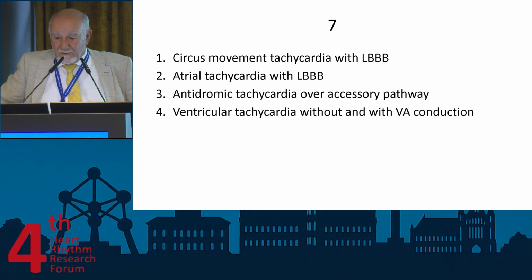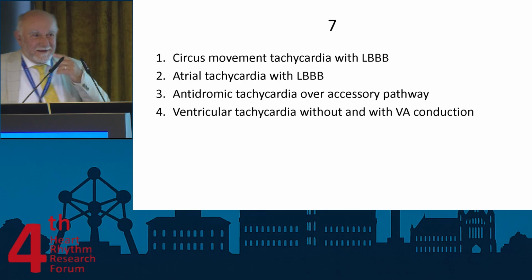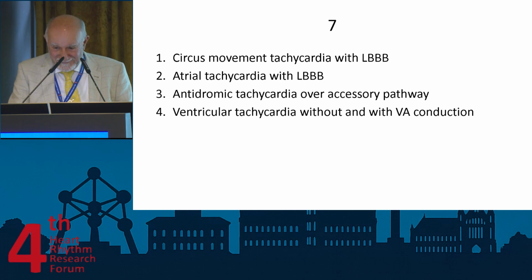Ventricular tachycardia with or without VA conduction? Nobody? What's there? Four? Four, okay. Okay, you said three. Yes. You too? Oh, wait a minute. I didn't see that one. Okay.